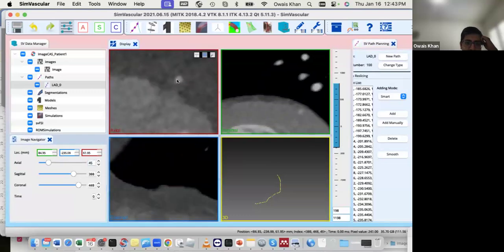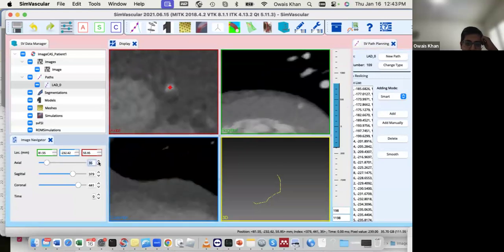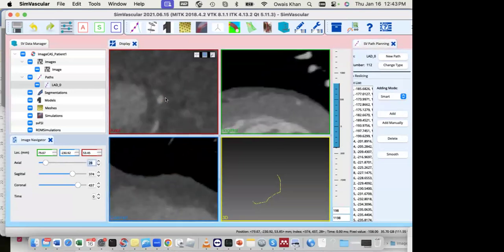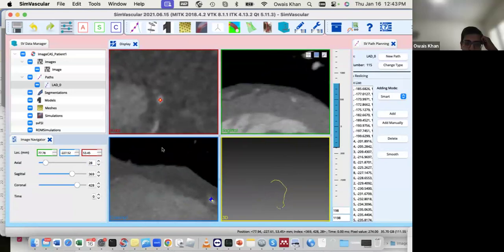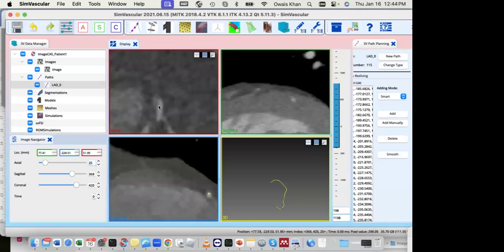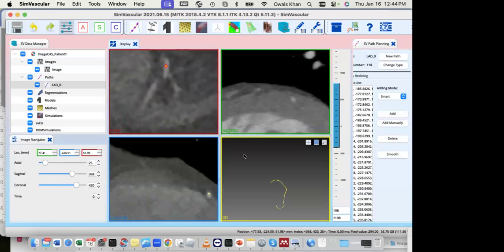As you can see, I haven't done this since I taught Anna maybe 4 years ago. She's back right now, but I'm gonna revise and improve myself. Yeah, good exercise. This is the heart apex right now. Oh wow. Where am I at now, Anna? Yeah, it is the heart apex. You're at the bottom. So now the LAD is basically turning around the heart apex, going toward the PDA. These are very good images actually.